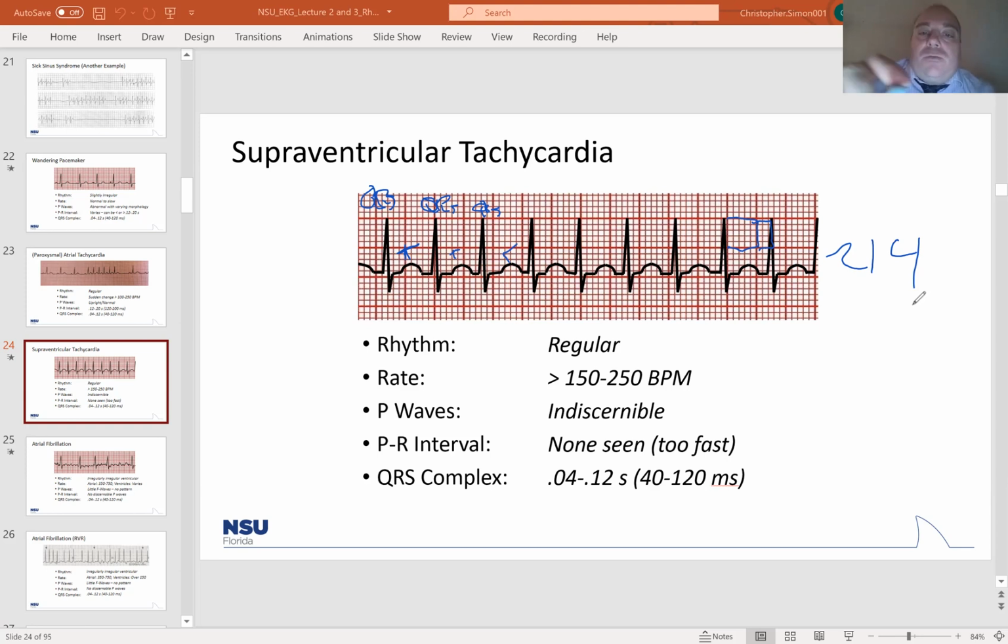Okay. So this QRS width is really narrow, and that's fine. So it's like 1 box, maybe 1.5, right? So it's between 0.04 and 0.06. Okay. So your QRS, right, is narrow. That's what we're getting at here. And what's left? Let's look at our R to R interval. Looks to me like the R to R interval is regular.